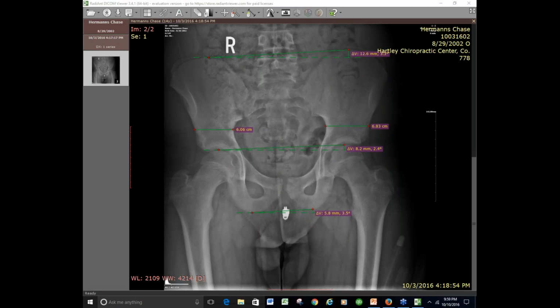Well, that's interesting you say that, because I positioned his feet as close together as possible so that the knees would just barely meet. Then I got them on an even plane, one not anterior to the other. I stood back and looked at this man, and he immediately bent over to the right. I mean, he was like the Leaning Tower of Pisa from his waist up over to the right. I thought, well, that didn't do much. Right. And so if we want to get him there, do we need to raise that right side to correct for that?